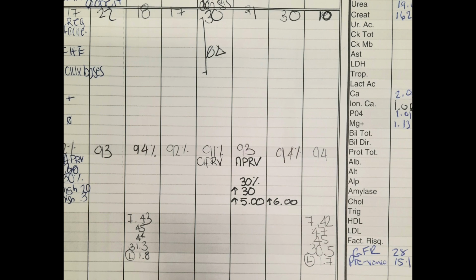If you look again above, there's some total rates of 22, 17, and right up to 30. This is when the patient was being stimulated. The patient was in a lot of pain due to that left-sided abscess and necrosis that had caused the PE. If you look, the T-high was then extended to 5 seconds, and again, an hour later extended to 6 seconds.